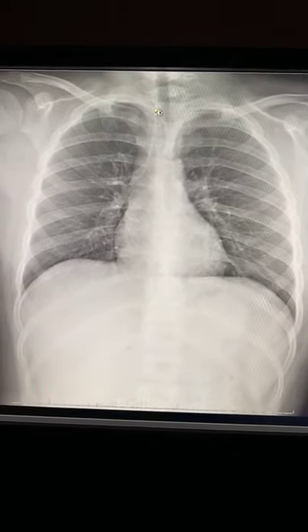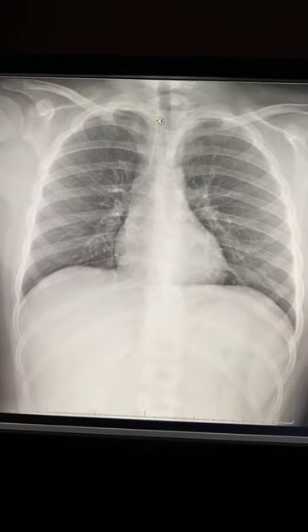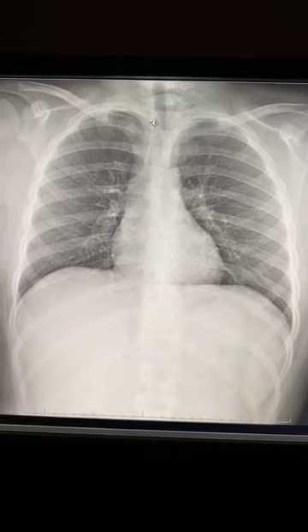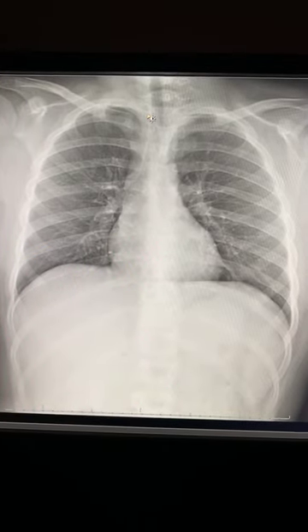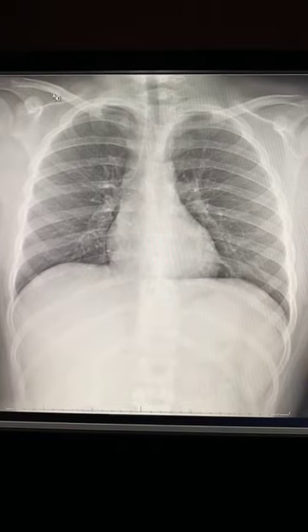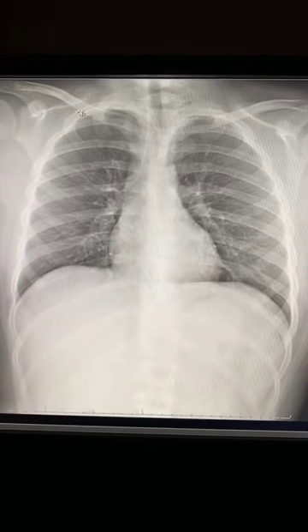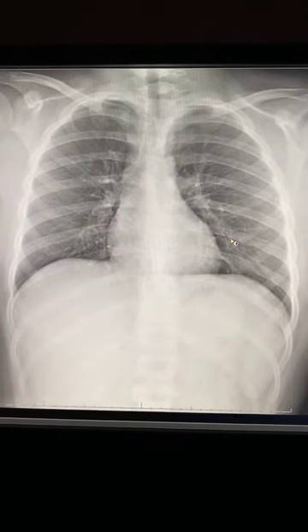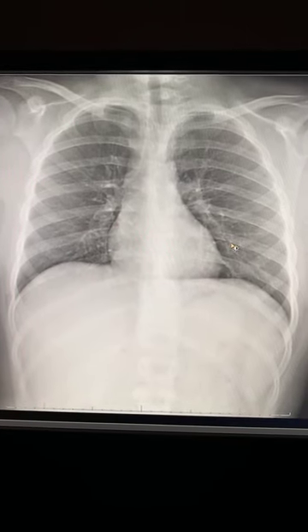And then the last thing that I look at are going to be the bones. I'm not too concerned when I'm initially looking at a chest x-ray for chest pain, shortness of breath, so I don't jump straight to the bones. Once again, that's just the way I do it. But bones now I'm looking at last. I look at everything. The clavicles look pretty good. Look at all the ribs. Everything looks good.